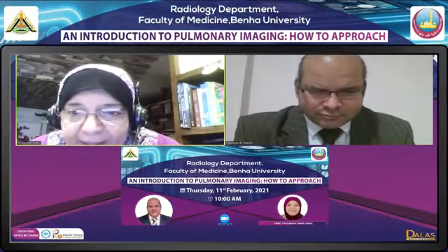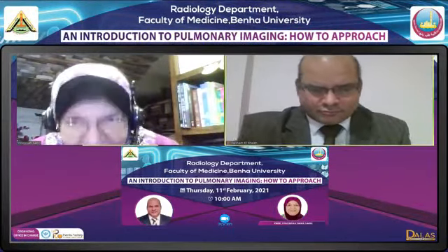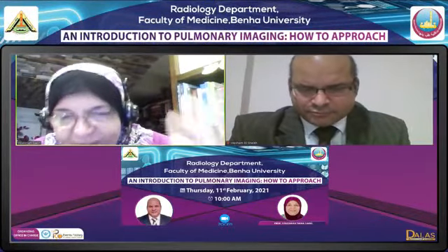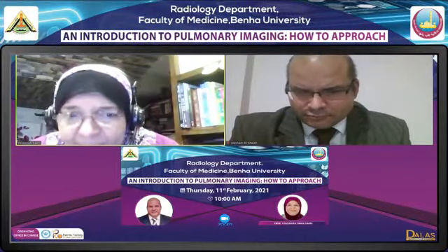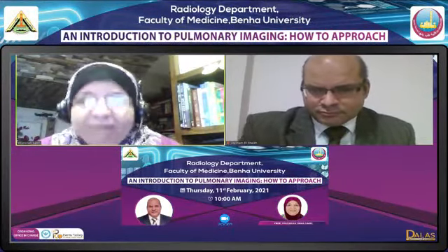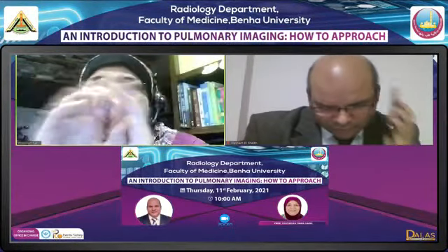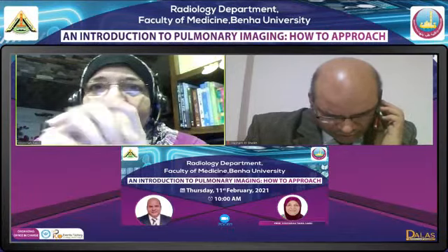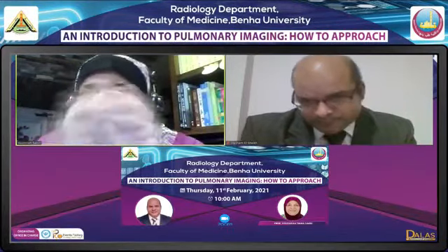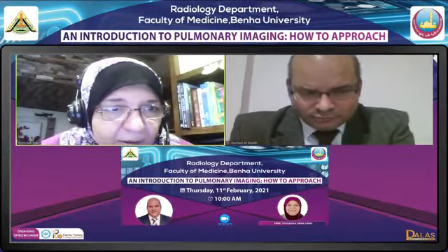فده قلنا عليه إيه؟ عمل ماس ايفكت. فده قلنا المنظر ده اللي هو أبيض في أسود والأسود دومينيتنج تمام. أنا ما أقدرش أقول هنا إن في حاجة مخرمة، الأسود هنا مور أور ليس دومينيتنج، ما علينا يعني. لكن المنظر ده كونجنتال بالمونري مالفورميشن تمام. فأنا ما ببصش على حاجة واحدة، أنا ببص على الحدوتة كلها. أوكي، عندي لوب كله أبيض في أسود ومعاه فوليوم لوس، ده سيكاتريشال كولابس.